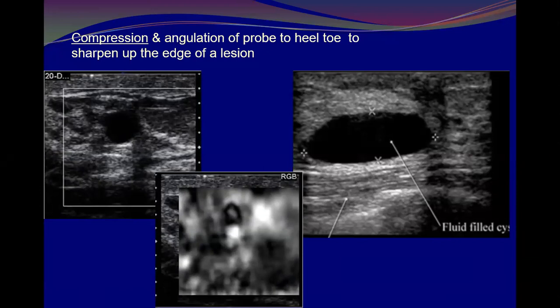Elastography. Excellent, elastography. But elastography is not always used for a cyst. If it is a very clear, simple cyst, there is no need to use elastography. But for indeterminate cases, if the margins are not very clear, or there are reverberation artifacts within the cyst that make it appear as a complicated cyst, then we can use elastography. And here, this is a typical appearance of a cyst.